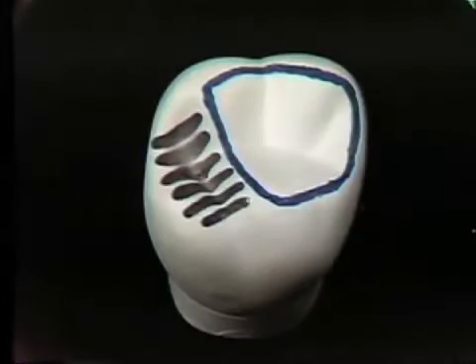The maxillary molars show a slight variation from the principles previously mentioned. The entire crown shape is not representative of the shape of the pulp. The shape of the pulp most closely resembles the part of the crown that is bound by the mesiolingual, the mesial buccal, and the distal buccal cusps. This forms a triangular outline shape, as you can see on the model of this maxillary molar. In deciding on the shape of the pulp, you should disregard the distal lingual cusp.